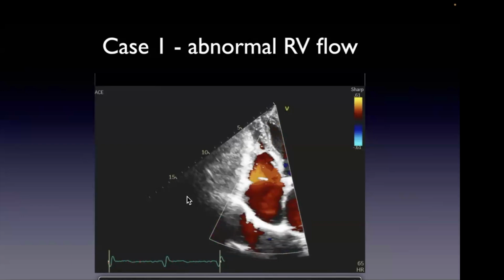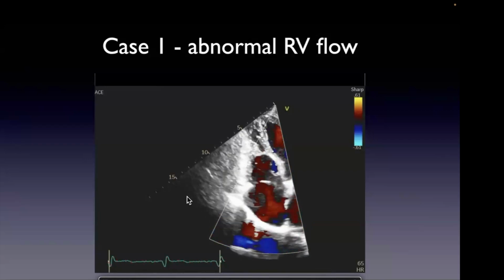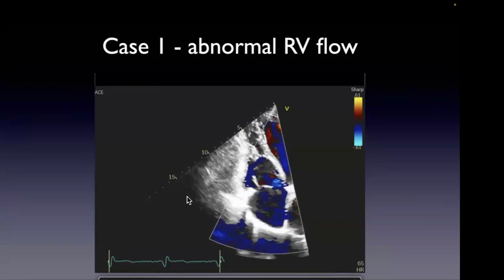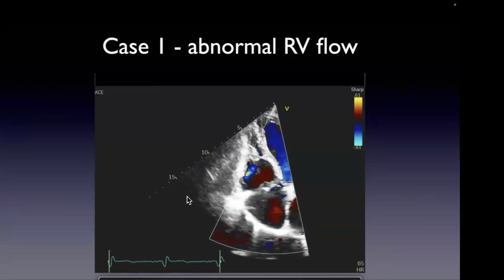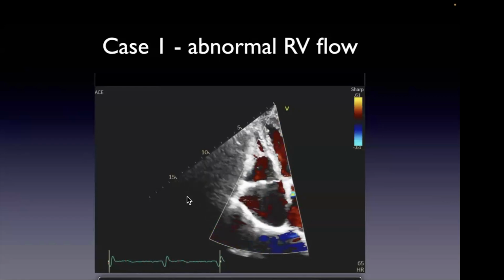So could this be a muscle bundle? Yeah, there's a bit of muscle bundle as well. I think that was what Grace was thinking about, maybe a muscle bundle obstruction at the mid RV level. We've seen that rarely. I think this is one of the things that was on the differential for this case. I've shown this case before in more comprehensive versions in previous rounds.